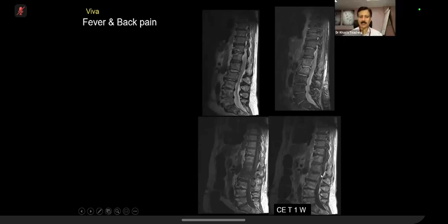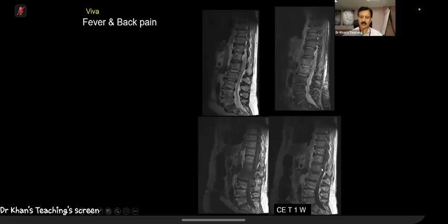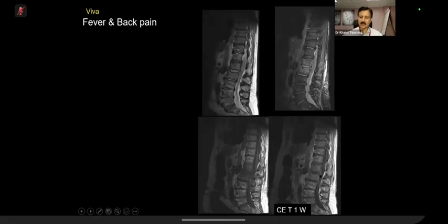My question is basic. Is it drainable? I don't think it's drainable. Let's go back to the basics. Is it an abscess? There's no non-enhancing component. Everything is enhancing, right? When everything is enhancing, it's not liquefied.